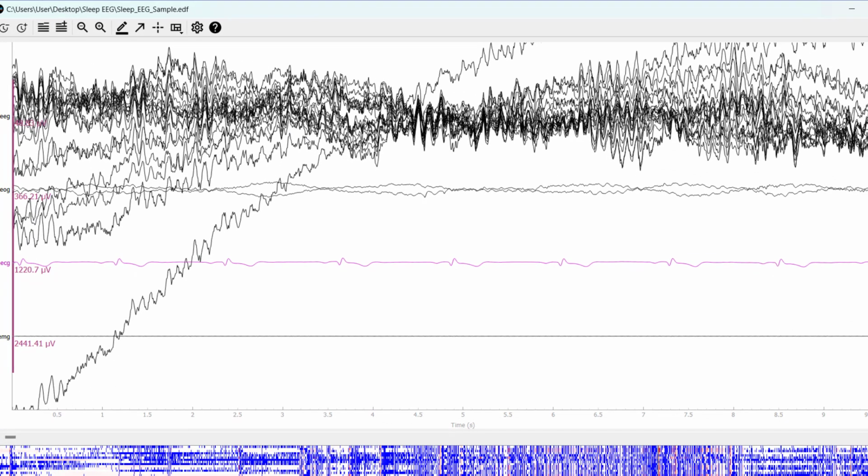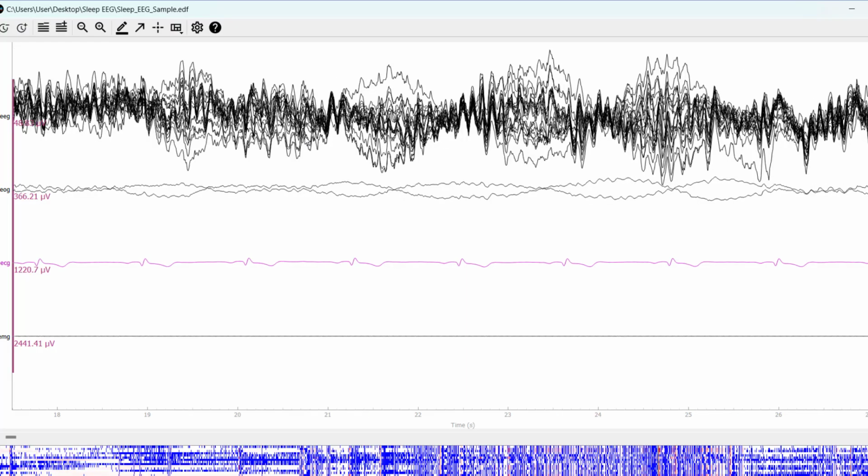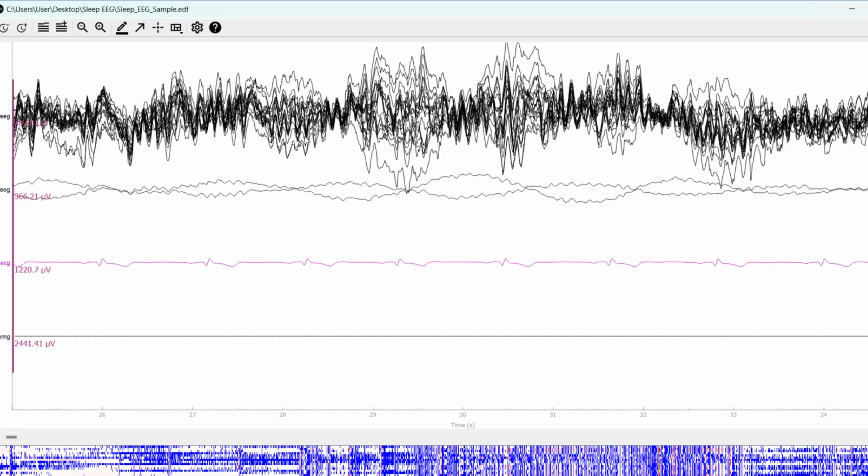So what does it mean? How can it help us? At first it looks a bit chaotic because every channel overlaps, but it is incredibly useful when you want to see the overall shape and consistency of your EEG data. For example, if you have 19 EEG channels and one of them is noisy, in the normal static view you may need to scroll down to find it. But in butterfly mode, that channel will immediately stand out as a waveform that doesn't match the others.